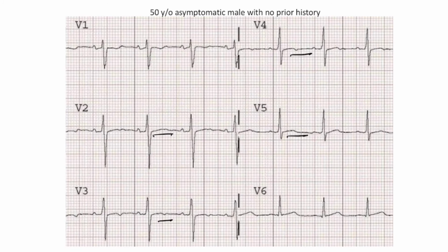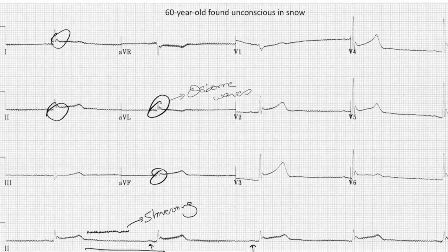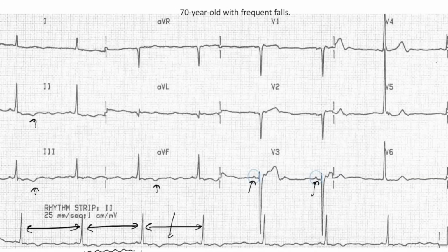If you see mild ST and T wave changes in someone with no concern for underlying heart disease, you call them nonspecific ST-T changes. Young individuals might have T wave inversions in V1, V2, and V3, and this might be a normal variant. Both shivering and tremor can cause the baseline to be very uneven and make determining the rhythm a challenge. Always try and figure out those subtle P waves that you can find on close inspection.